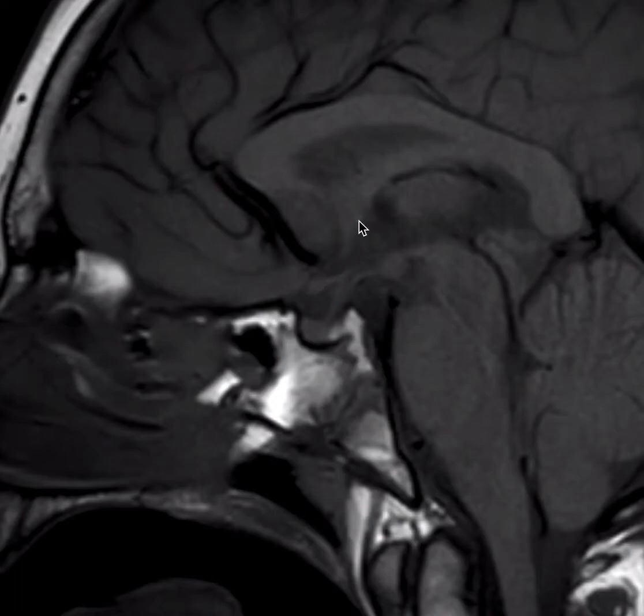and will also include everything along the floor of the third ventricle in this region. So here again, I'm going to draw the outline of the hypothalamus, going from here to here in the posterior commissure, and from here to the infundibular recess, and then over here to include the chiasmatic or supraoptic recess, and back to the anterior commissure here. This will encompass all the nuclei vital for the hypothalamus.